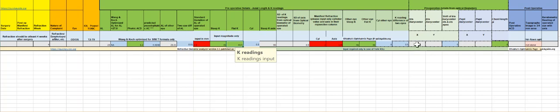So in the X and Y coordinates, you get this data from the optical biometry, and I put this as 0.2 and this as 0.3. This is not a simple addition. There's a formula that goes in. So how far is the optical axis deviating or far away from the corneal vertex? It is well within the limits here in this patient. But what if I put this as 0.9 and something else? What it shows is a red flag, meaning that this patient's optical axis is well outside, away from the visual axis.